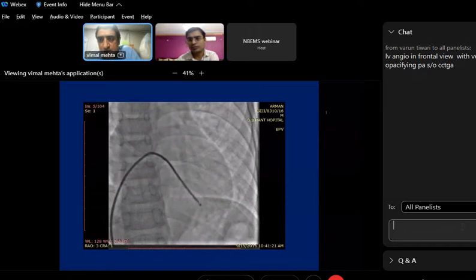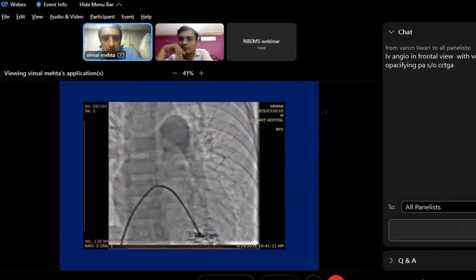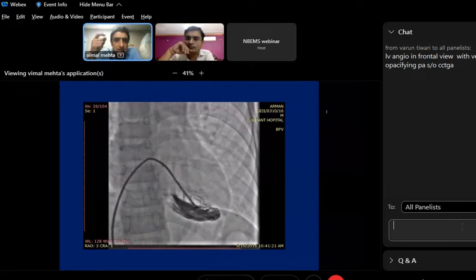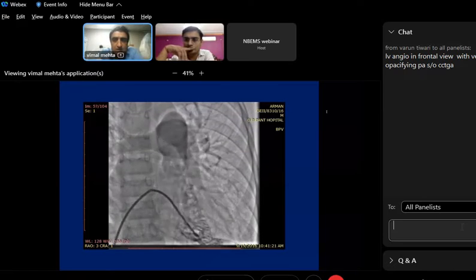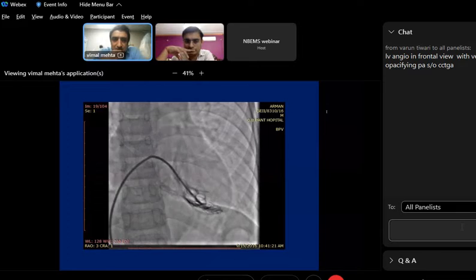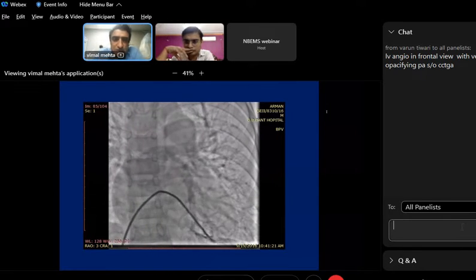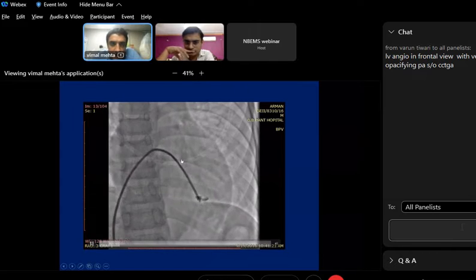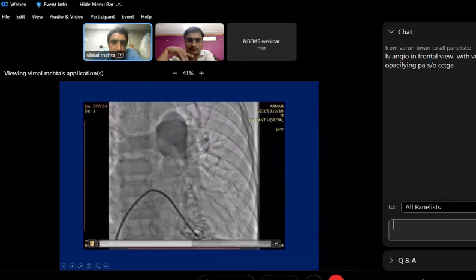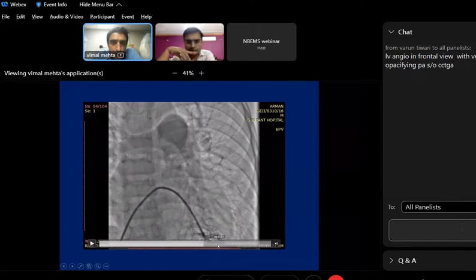What all you see? Concentrate on the valve. Normally what happens is, first of all you must identify the view. Which view is it? And normally you will not be able to see the valve this well. And if you see carefully over here, let me concentrate if I can stop it, the valves are not opening.